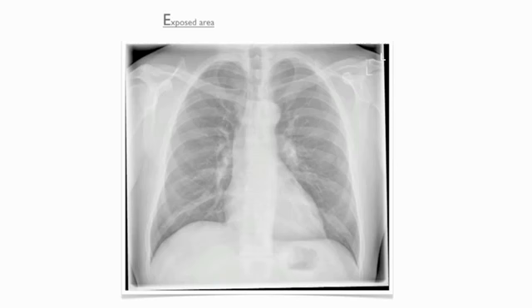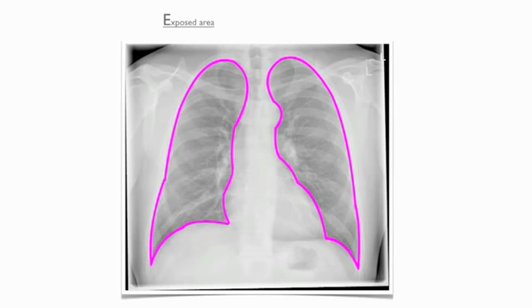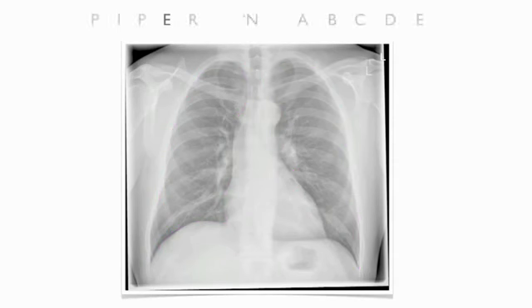Exposed area. You must be able to see all of the lung zones on the radiograph. If you cannot see them, you will not be able to make a reliable diagnosis.